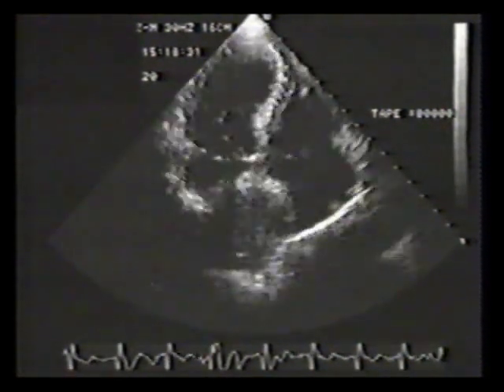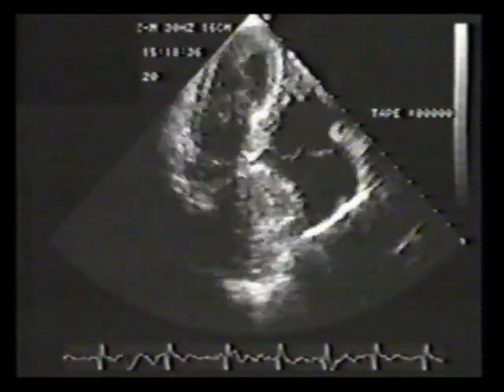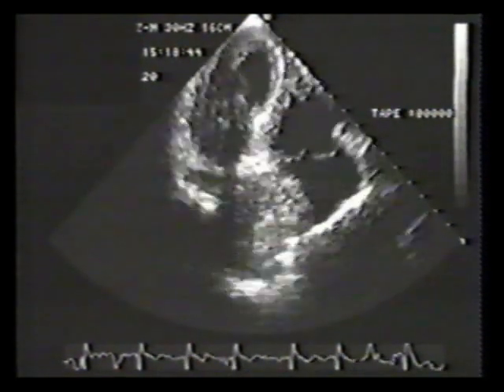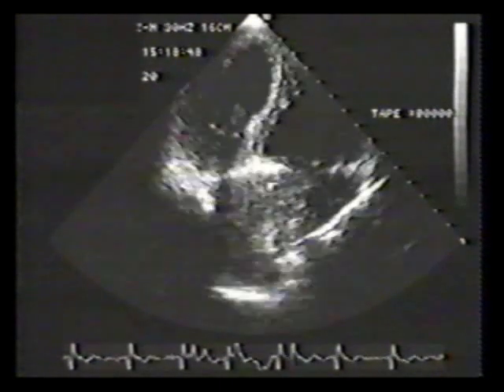This mass occasionally is confused as either a solid tumor or an atrial myxoma. Swallowing carbonated beverage will frequently elucidate the etiology. Also, a plain upright chest X-ray will assist in diagnosing diaphragmatic hernia.